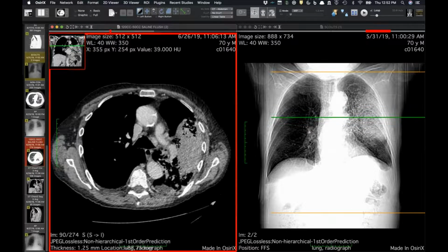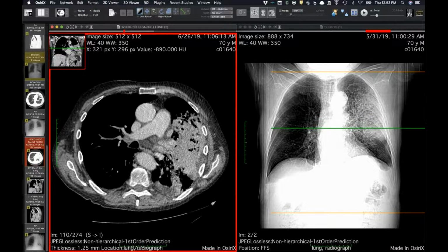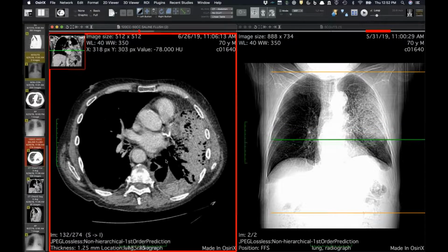And you can see how on the axial, they do twist and attenuate a little, but the veins get pretty darn narrow there, but there's still some blood flow getting through this. So they were able to save the lung.